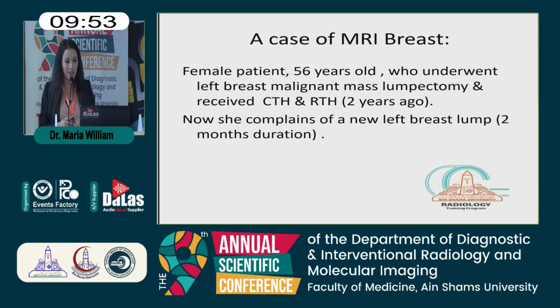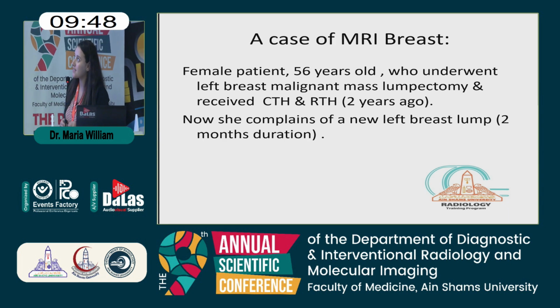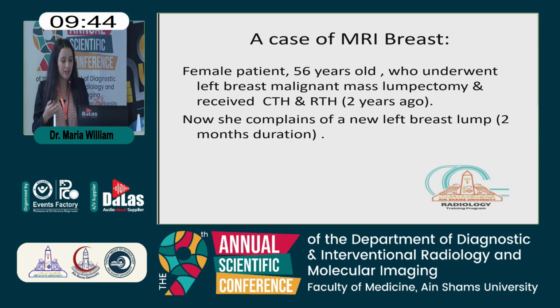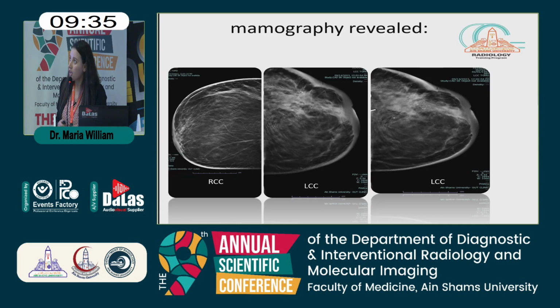A female patient, 56 years old, underwent left malignant mass lumpectomy, received chemo and radiotherapy 2 years ago. Now she is complaining of new left breast lump, 2 months duration. We will start with mammography.